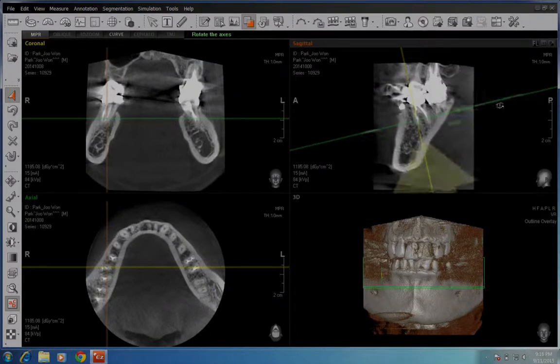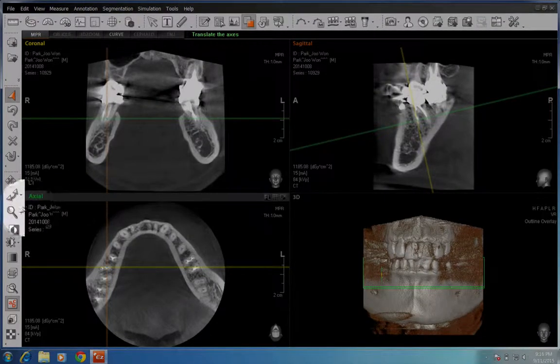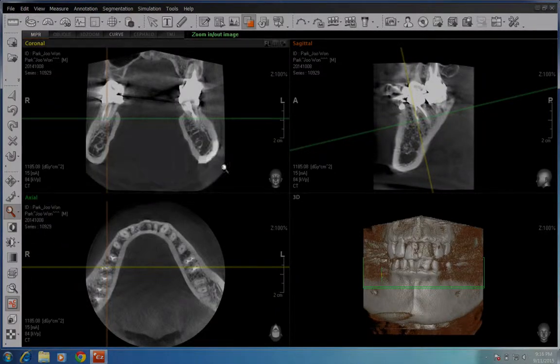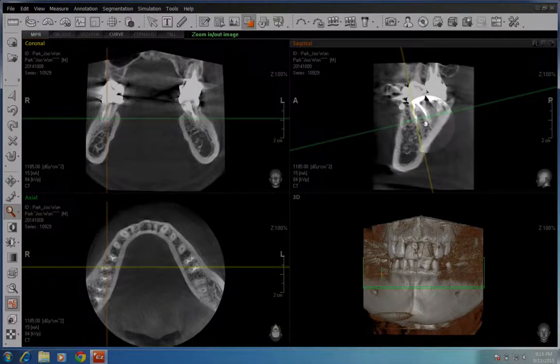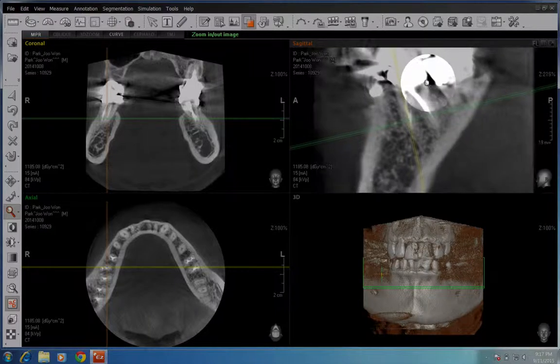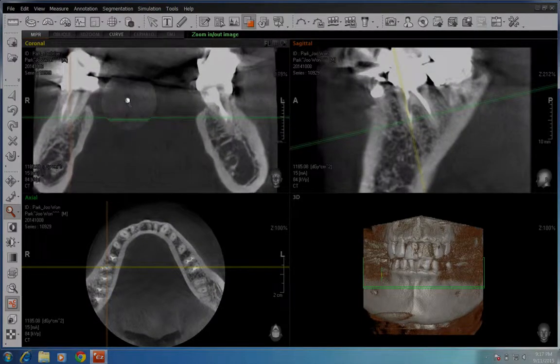Okay, so I just changed the pitch so that we are looking at this root dead on. Now, of course, if you look at that, you go, well, that's nice. However, it's kind of small, so you magnify it. You go to the very left, you click on the magnifying glass, and you click single. And then when you go to this area, you click on it, hold down the left mouse, and slide it forward. There you go. Okay? And then you can do the same thing on this one. Click on the left mouse and slide it forward. All right.